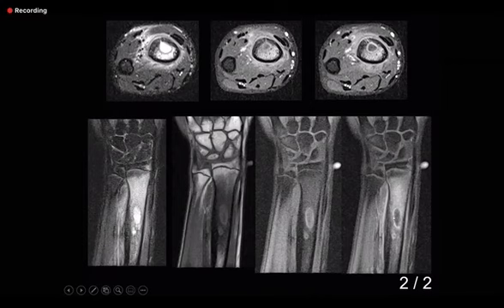And then it shows enhancement. Here, of course, there is a cortical breach. There is a soft tissue phlegmon also. So the point is, this is an absolute specific thing. There is a black and white world in radiology, and there is what we call a gray world. When you are in the black and white world, be confident, and this is what they are testing.